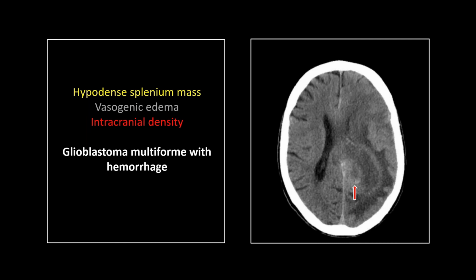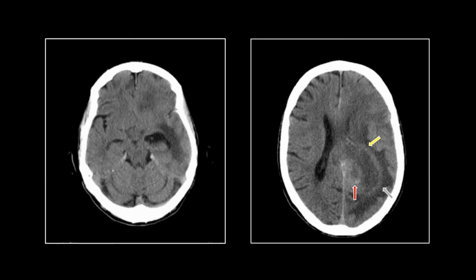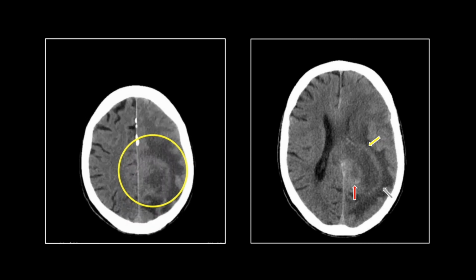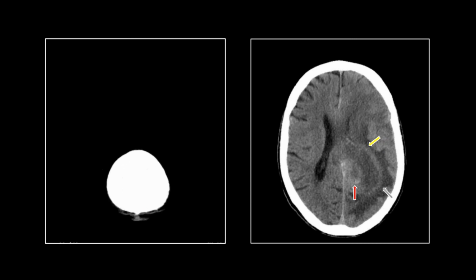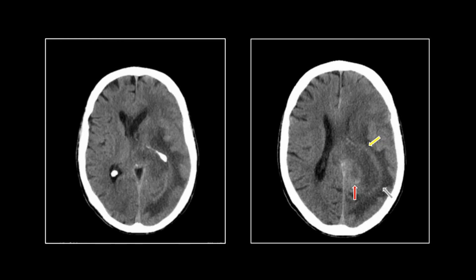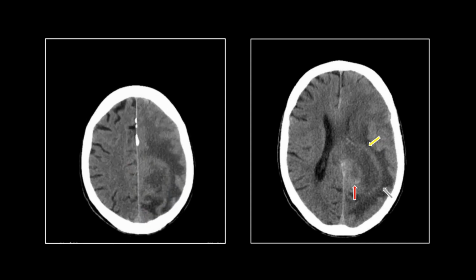And in fact, metastases, MS, the sorts of things you might be thinking of, that presence of density, either calcification or more likely some non-acute hemorrhage, is really suggestive of a GBM, which of course is characterized by necrosis and hemorrhage. So it's a helpful sign there, and that is in fact what this was, an acute presentation of. You see there's even some asymmetric hydrocephalus, vasogenic edema extending all the way up into the parietal lobe, and sulcal effacement throughout the entirety of the left hemisphere.